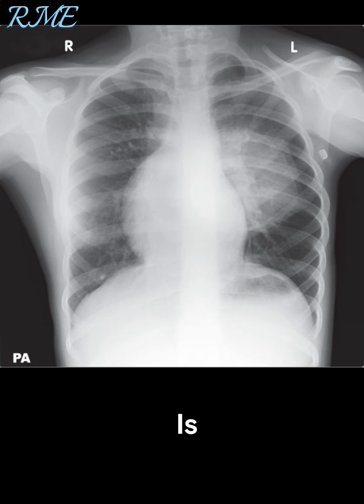A metallic density is present in the left axilla, and the pectoral girdle appears asymmetric, being deficient on the left. The left second to fifth ribs are slender in comparison with the corresponding right ribs. The lungs, mediastinum, and thoracic skeleton appear otherwise normal. The difference in transradiancy cannot be explained by patient rotation, since the patient is slightly rotated to the right side.